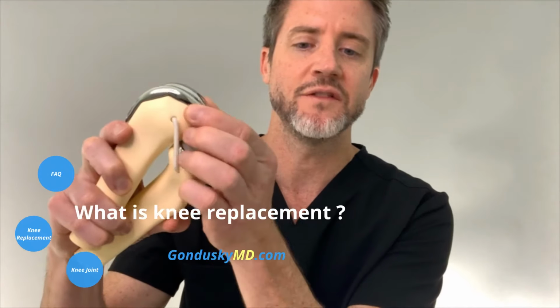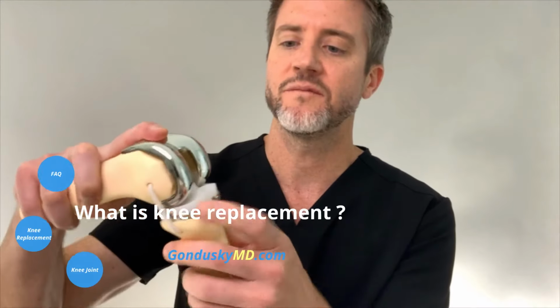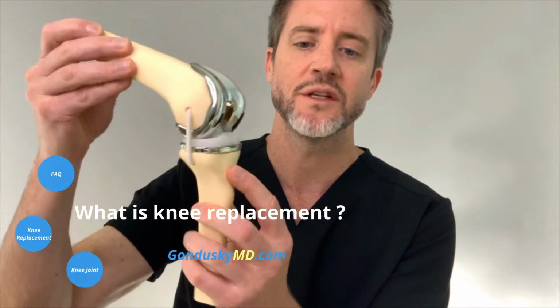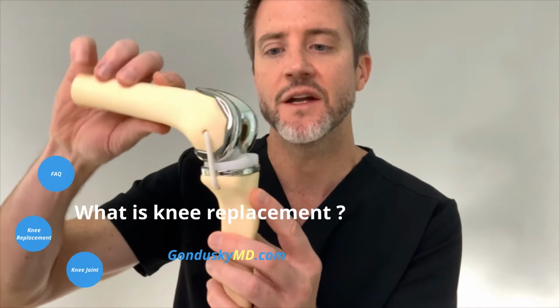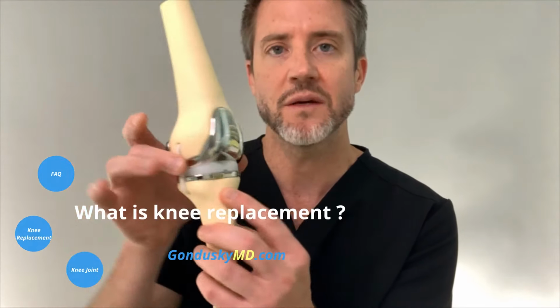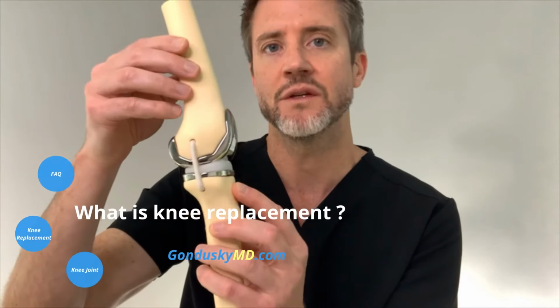A cap goes on the end of the femur, and then a flat piece of metal goes on top of the tibia, with a piece of plastic in the middle, and so no more bone-on-bone contact. That joint is totally replaced. So this is a total knee replacement, and that is what is happening. And so again, it still moves like a knee joint, still acts like a knee joint, still balanced by the ligaments on the side of the knee joint, but no more bone-on-bone contact. That's a total knee replacement.